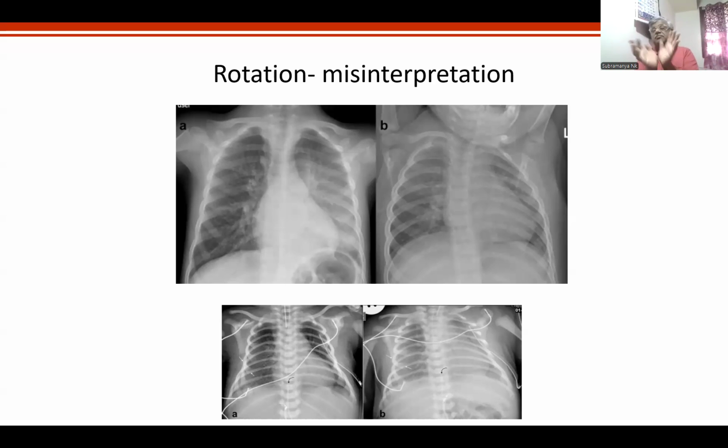You know, astigmatism. Remember, in cornea we use that word. Now this is a perfect example of an X-ray which is rotated in various ways. It's not horizontal, and this can give rise to kyphoscoliosis. That is one part. But the second problem is not kyphoscoliosis. The second problem is the chest on one side can shrink vertically or open vertically on the other side, shrink horizontally, vertically, or now imagine not just horizontal and vertical, you imagine all dimensions.